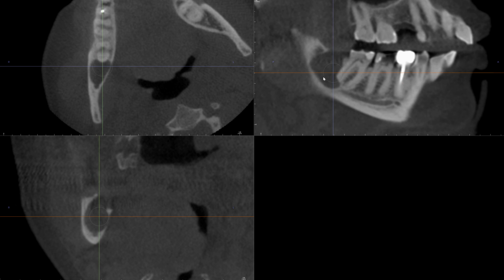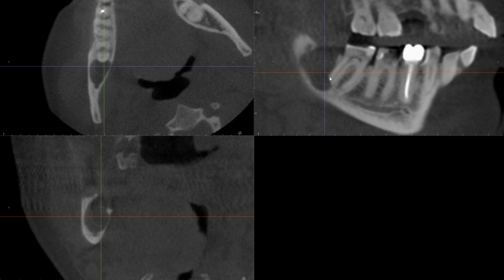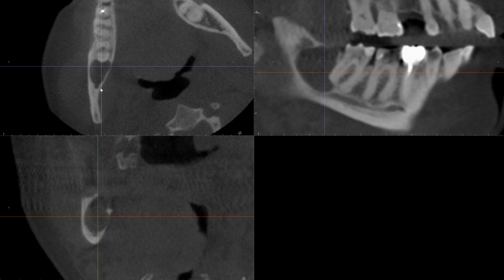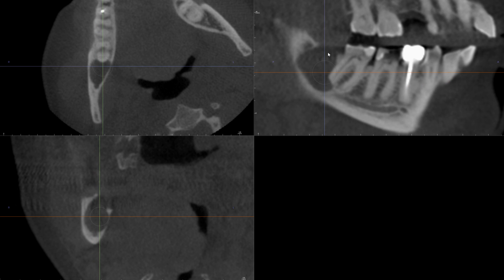What about its behavior on the distal root? I think it's a little bit difficult to note. But the distal root apex does appear ever so slightly flattened, and we should definitely consider the possibility of root resorption here. Another feature that we can see is that as we go over to this area, the alveolar crest has been disrupted.